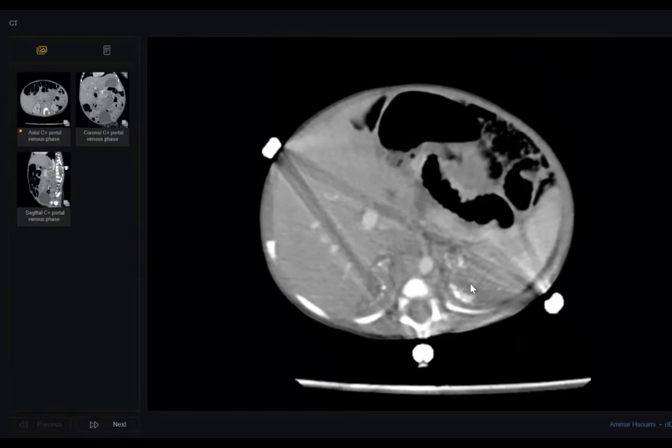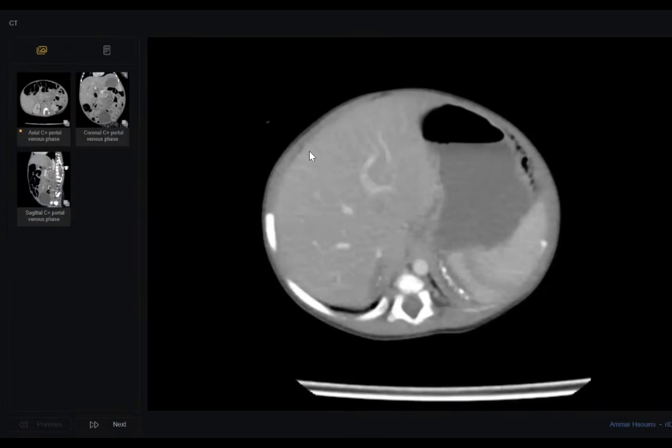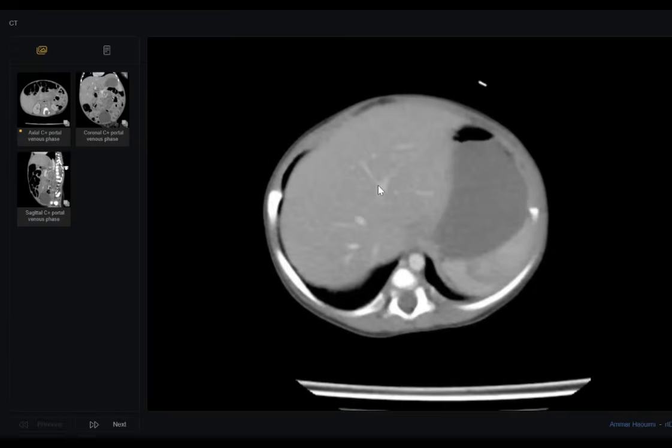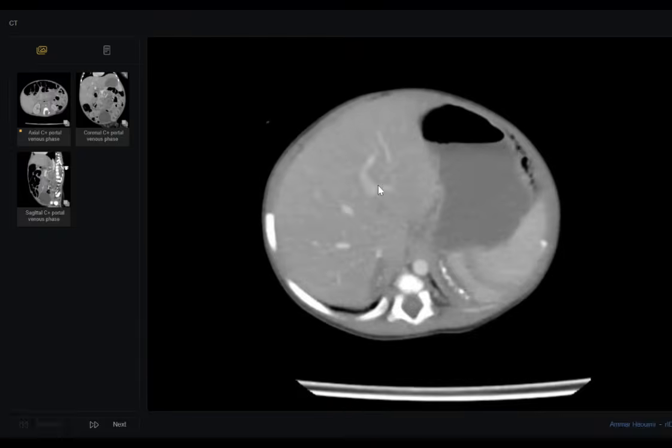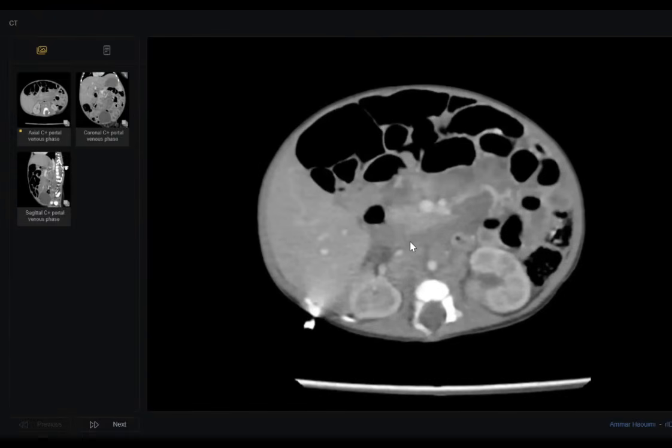Other causes, hemorrhage. But hemorrhage and neuroblastoma will not be associated with bilateral enlarged hepatosplenomegaly. Plus, as you told, this is lymph nodes.